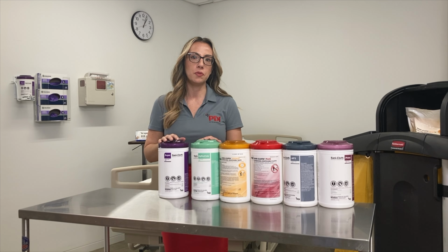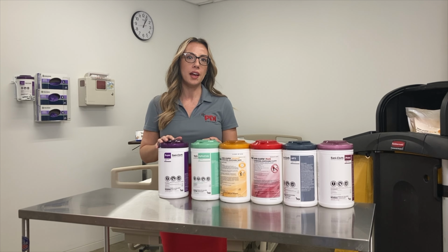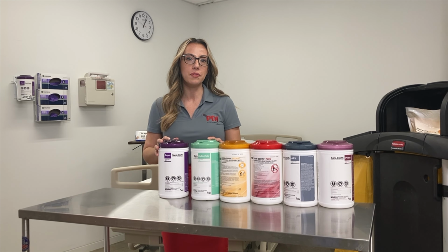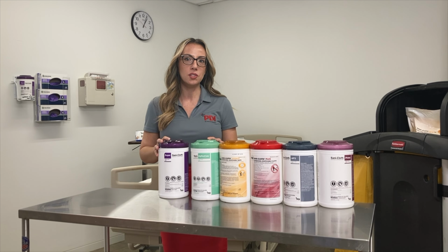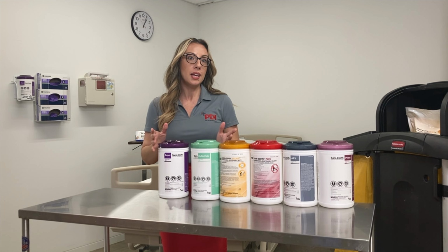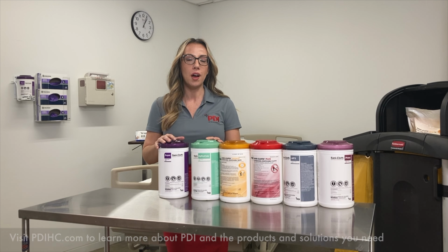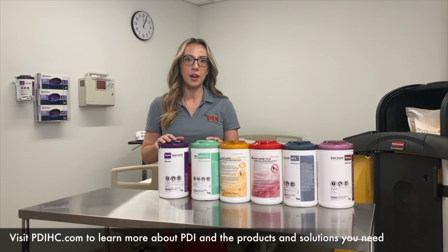It's all about ease of use, providing products that are readily available, compatible with equipment, clinically effective, and backed by a long history of customer acceptance. Today we spoke about our disinfectant wipes, but PDI has several products that offer a layered approach to infection prevention.